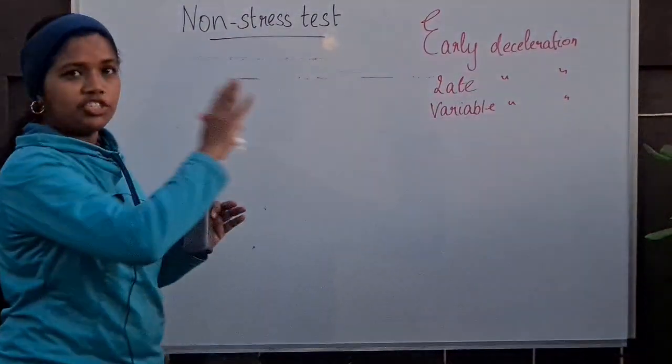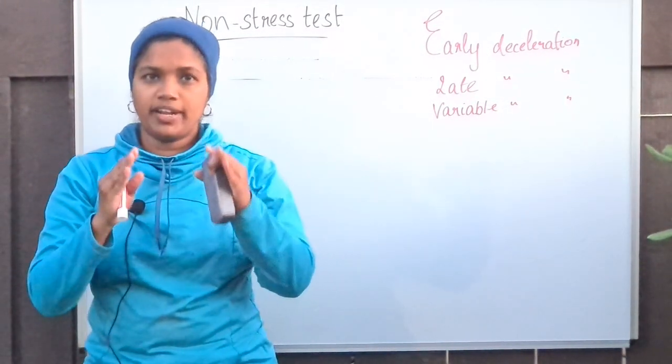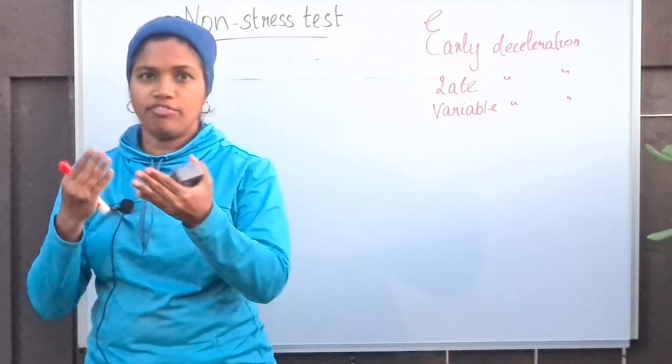What is a non-stress test? Non-stress test is nothing but a graph which is used to find the uterine contraction as well as the fetal heart rate.